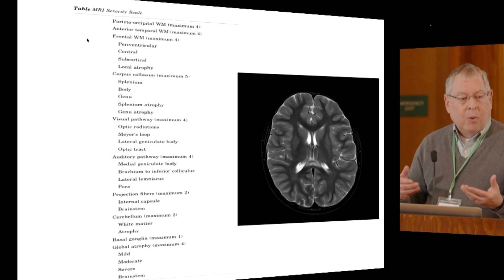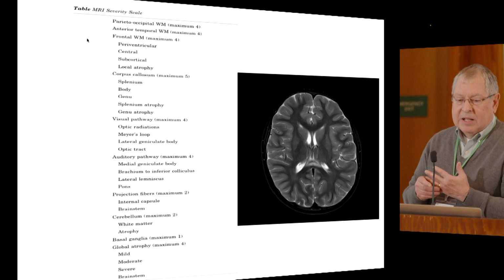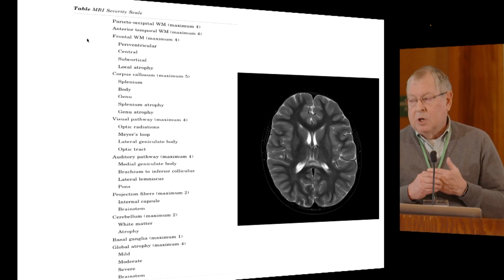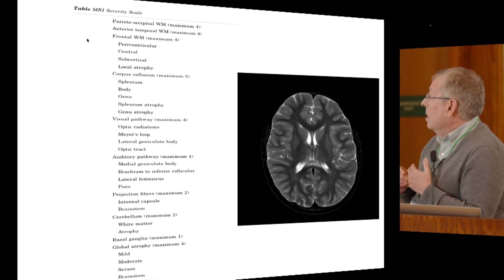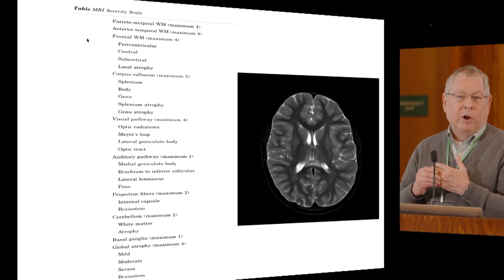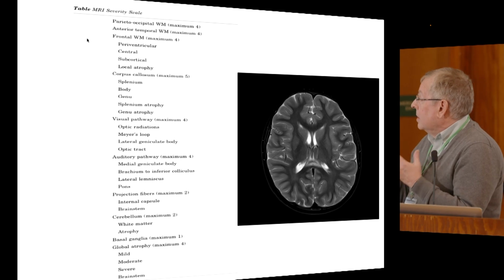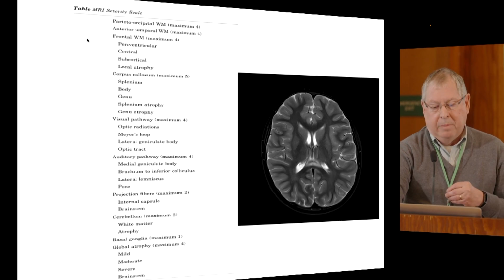Now, I'm throwing out words here that you would go, I don't know what that part of the brain is. That's why some of this should be left in the hands of people who know. Okay. But I'm going to highlight here, without the arrow, that the splenium of the corpus callosum here is involved. That's that bright signal there in the back. So what would my score be? Volunteers from the audience? It's a 1. I'm going to give it a 1, just based upon what gives me that vibe.